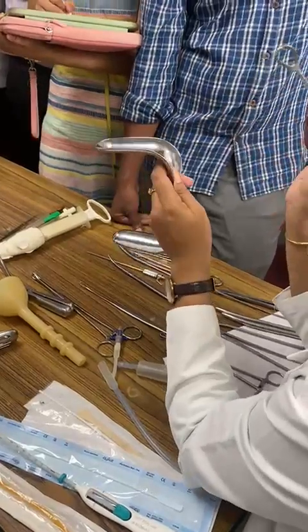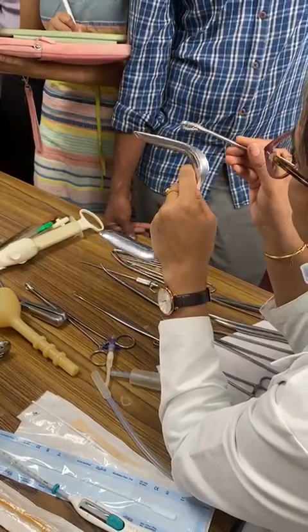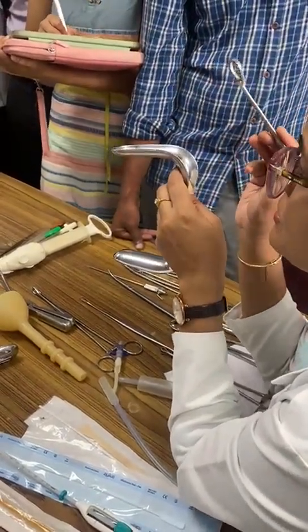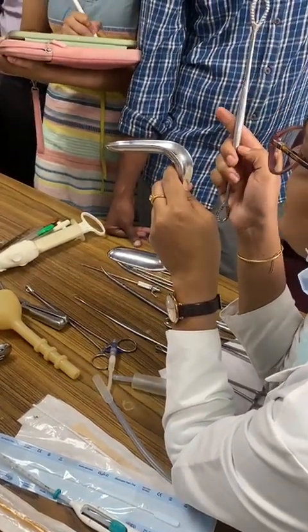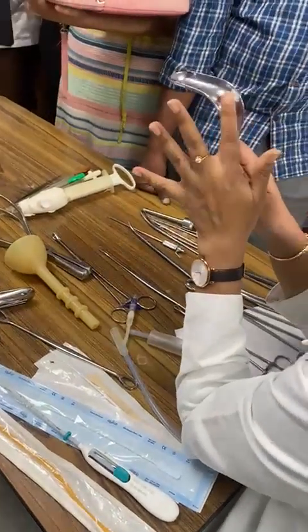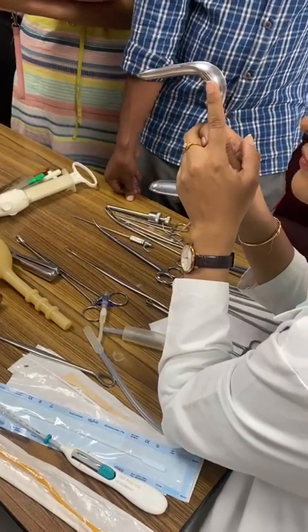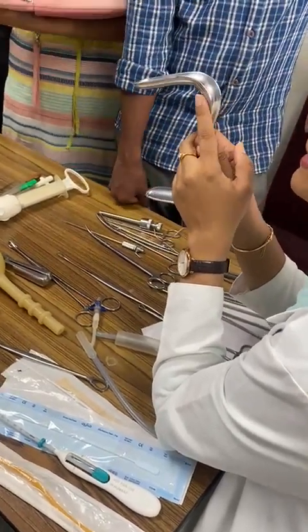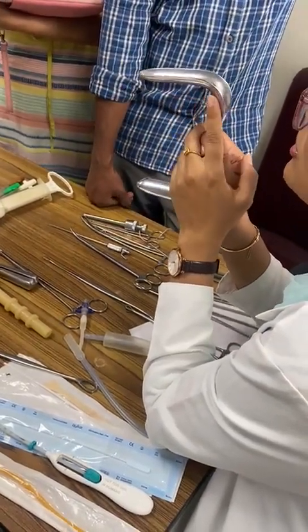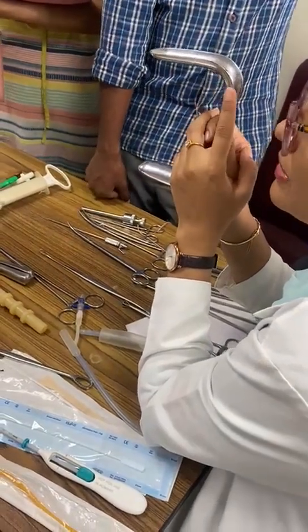Along with this, you need an anterior vaginal wall retractor, because it is not self-retaining and doesn't have 2 blades. It has only 1 blade. So you will have to push the anterior vaginal wall using the anterior vaginal wall retractor. Where else is this instrument used? Again, for examination, taking pap smear, taking endometrial biopsies, then for colposcopy and vaginal surgeries. All those things you'll have to name.